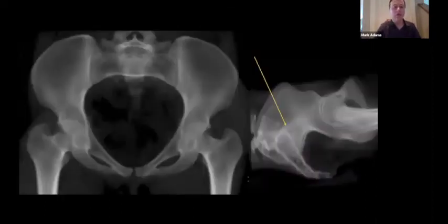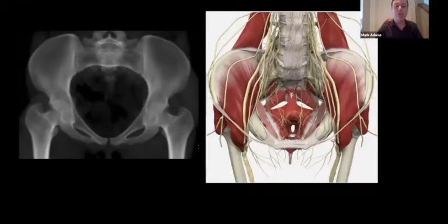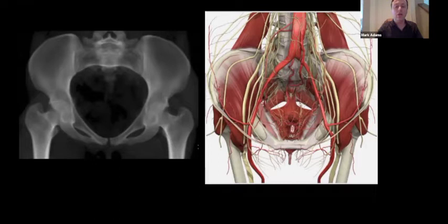The inlet view is relatively orthogonal to the outlet, viewing the sacral bodies stacked one on top of the other, and needs to be a well-centered and symmetric appearing sacrum. Once again, we see the intimate relationship between the lumbosacral neurologic plexus and the anterior sacrum, as well as the plexus created by the internal iliac branches and the external iliacs descending by the iliopectineal eminence again. Naturally, there is the corresponding venous network here as well.